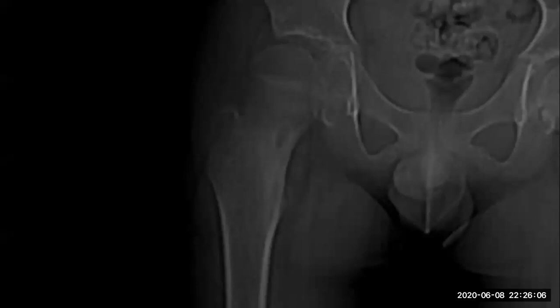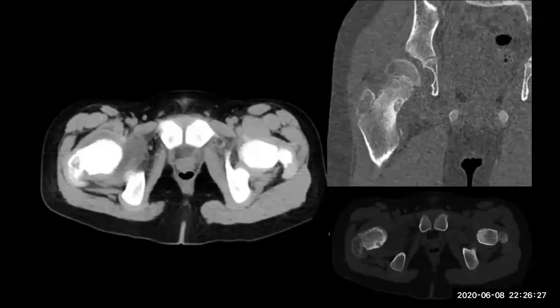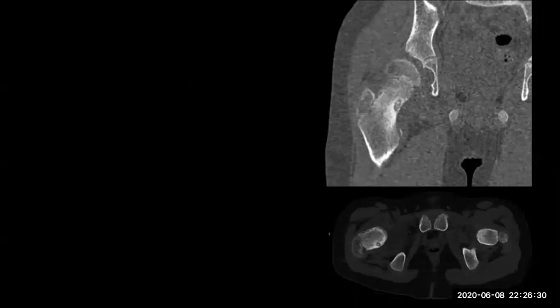Okay. How do you prove what you said? By CT. What do you see on the CT scan? There is a nidus inside. A radiolucent nidus, or the vessels. Okay, this is the CT scan. Nidus.